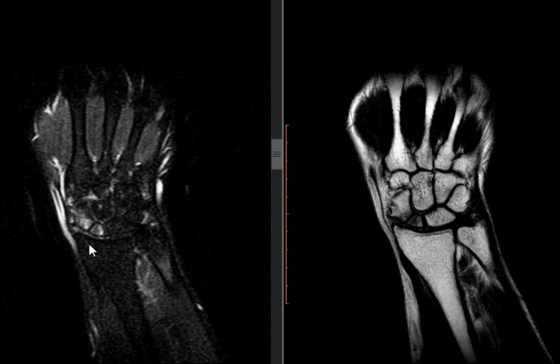It is typical, there is nothing more typical than this. As an approximation we won't write avascular necrosis. There is a fracture at the waist of the scaphoid associated with bone marrow edema at the proximal and distal fragments, suggesting endangered or impending avascular necrosis. If you leave it, it will go into fully necrotized bone, fully dead bone.